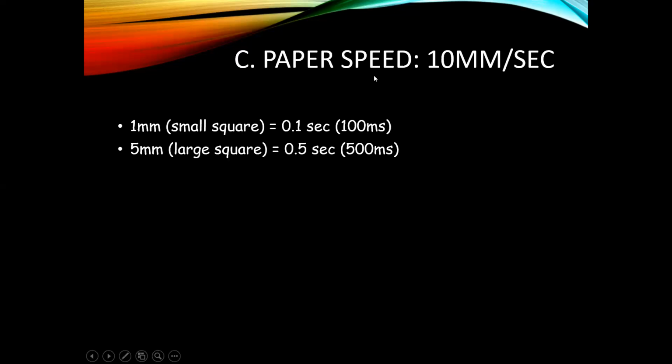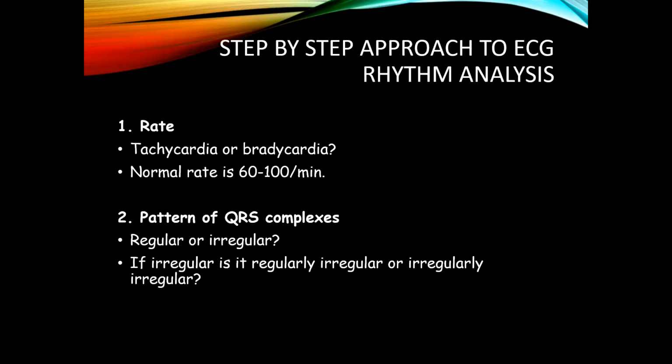Then the next speed is 10 millimeters per second. In this one, 1 millimeter represents 0.1 second, and 5 millimeters represents 0.5 seconds.